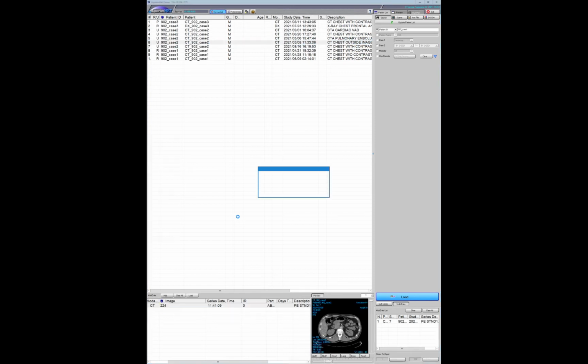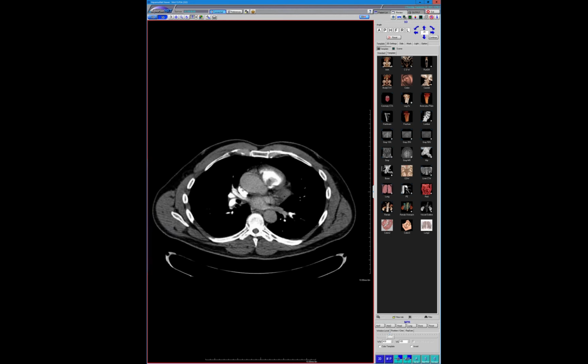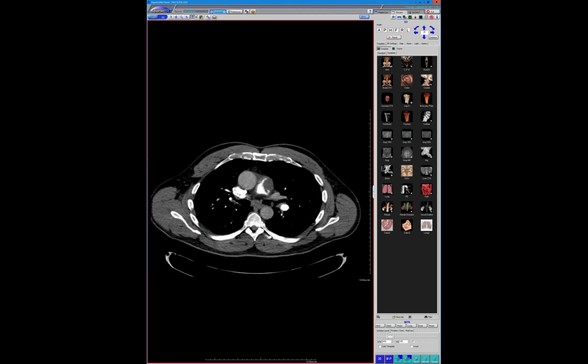Let's go back to this. This is just a sad case of something I see a fair amount of here. Of course, it was called a PE on the outside. You can see the big soft tissue mass in the pulmonary valve, and then extending along the wall, kind of like a sausage, some soft tissue all along. And it really is amazing.